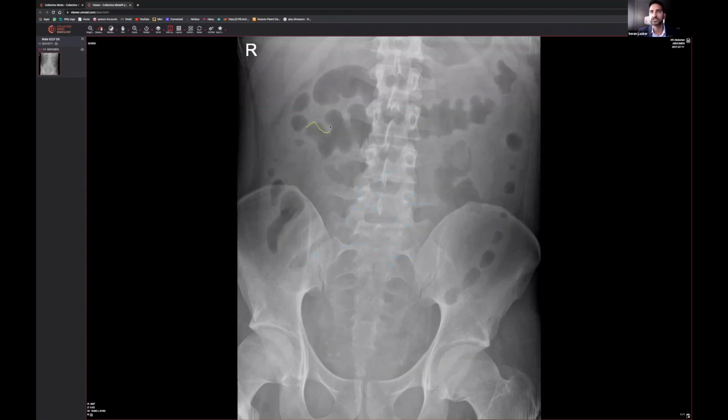But when you look at this transverse colon, you can see it's very, very irregularly contoured like so. It feels like, exactly like someone said, like someone stuck their thumb, pushed it in there and made a bit of an indentation. So this basically means that they've got what looks like colitis involving the transverse colon, and that can happen because of ulcerative colitis or anything.